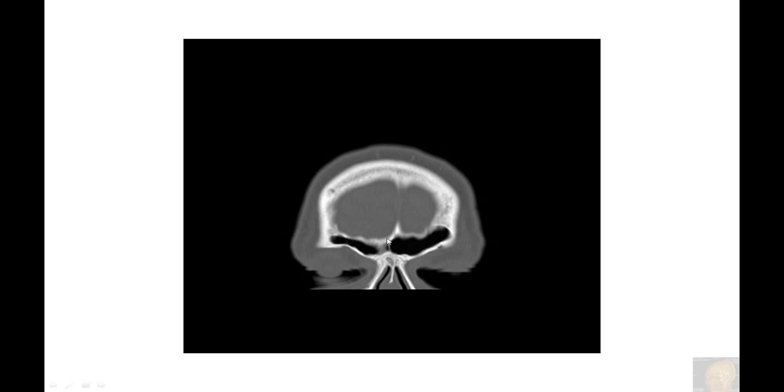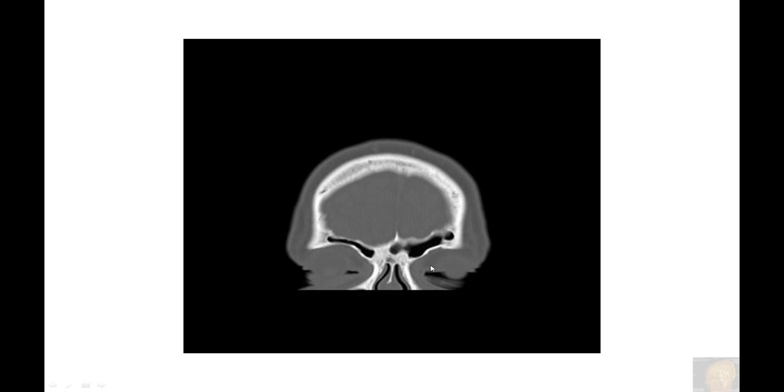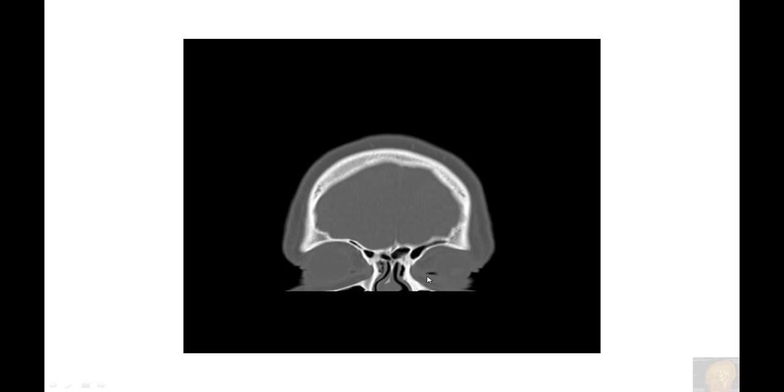Notice that the skull base, which is the floor for the brain, is quite rough and bumpy. So when the brain is shifting, such as in a motor vehicle accident, it can be contused, meaning injured, because the floor is not smooth. So the frontal part of the brain, especially adjacent to the skull base, is easily injured. I keep scrolling towards the back.